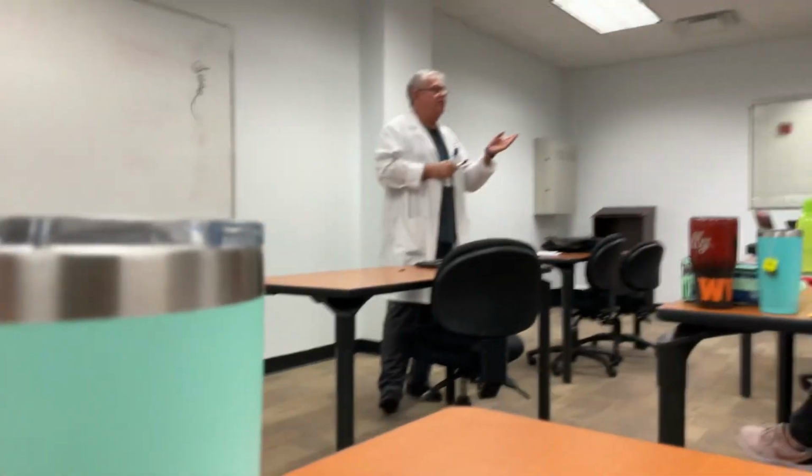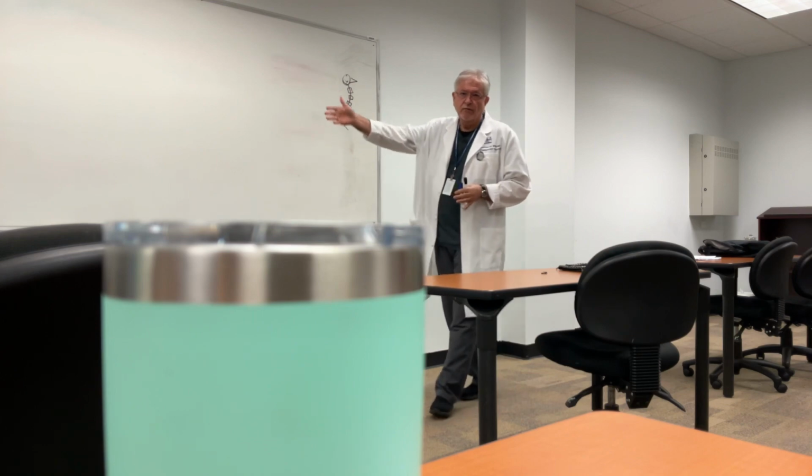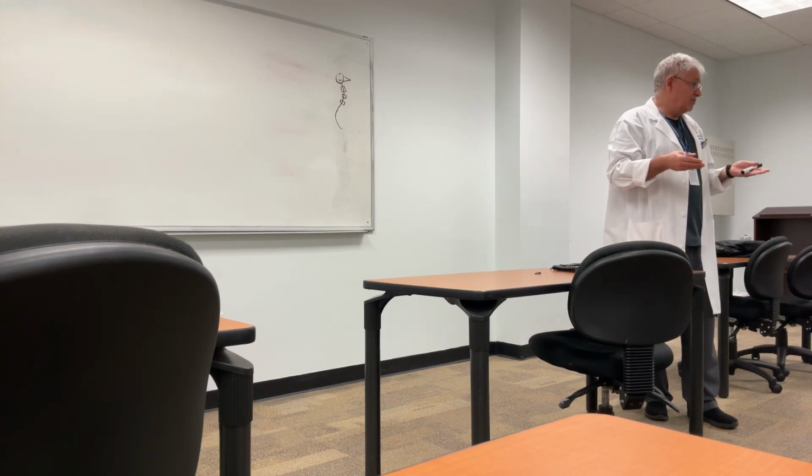Project. The project is in week 4, it's project number 1. So it'll show up on the screen, right? Okay, but before we get to the screen, we're going to have to attack or approach a lateral search pattern. I've chosen to do a search pattern. So how do you want to start looking at a neutral lateral cervical radiograph is the challenge.